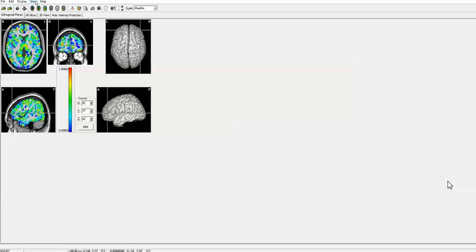This is a new display that we're developing that will be present in the future in NeuroGuide. It's being developed primarily by Ernesto Soler. It will be initially implemented in our Evoke Potential program, and then also we will be using it in NeuroGuide as well. This is a preliminary display in which you can see there are sagittal, horizontal, and coronal images here.